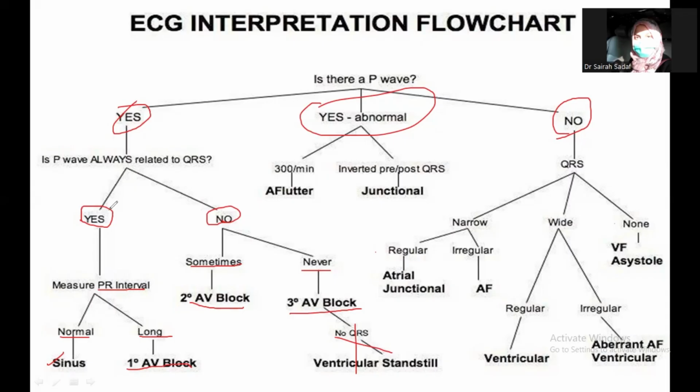And P wave is present. Yes. It is related to QRS complex. Yes. So look at the PR interval. It's normal. Yes. It is sinus rhythm. PR interval is long. It is first degree AV block.